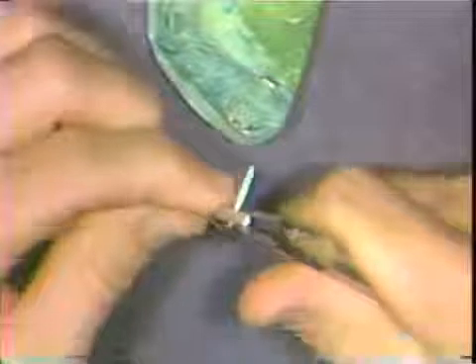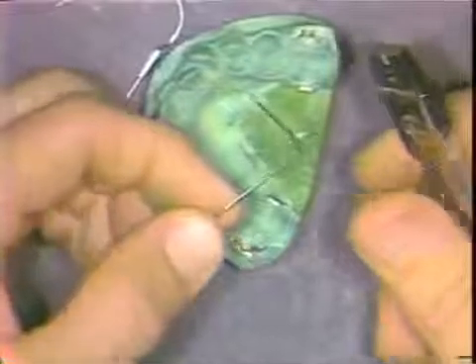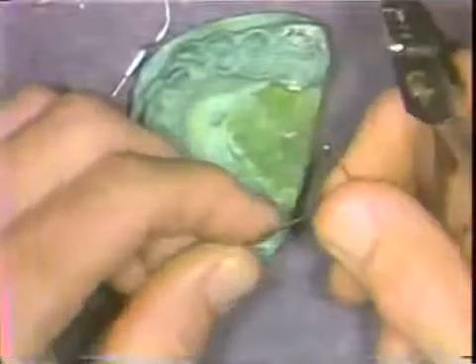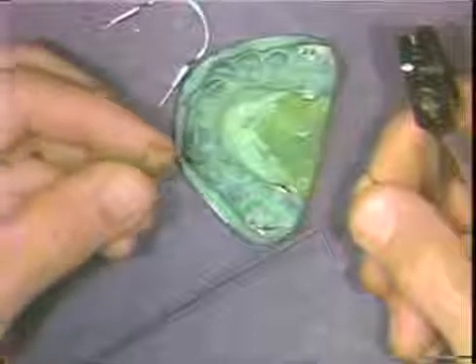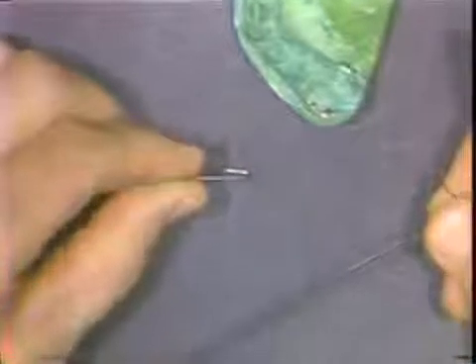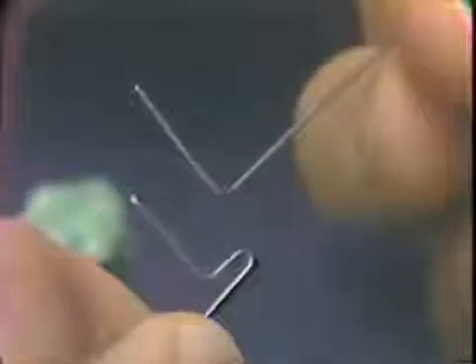The plier is moved to achieve a perfect right angle and maybe a little on the acute side. Let me refer in a moment to the step that we are going to produce, a folded back portion, and you are looking now at the right angle portion that I've already constructed.